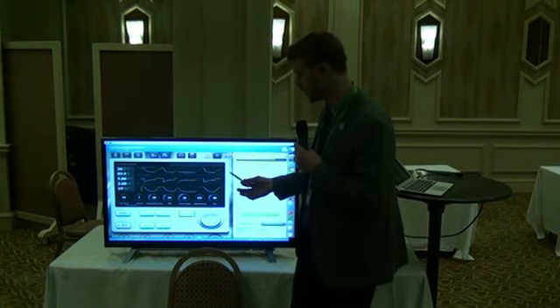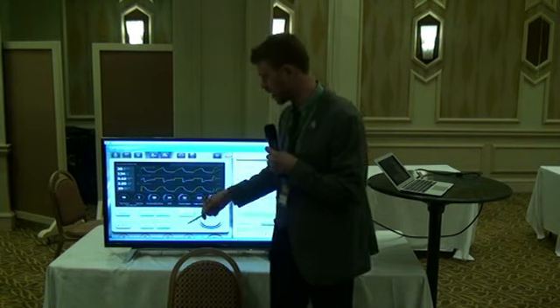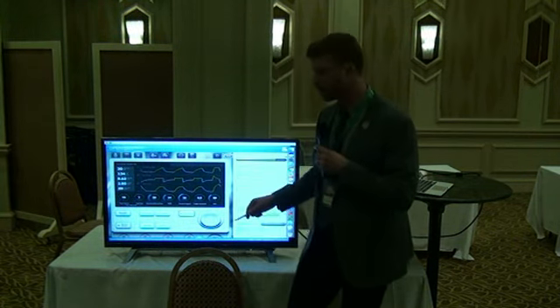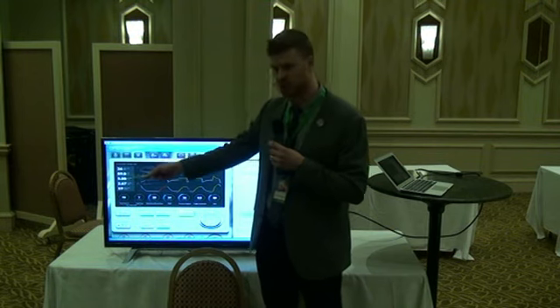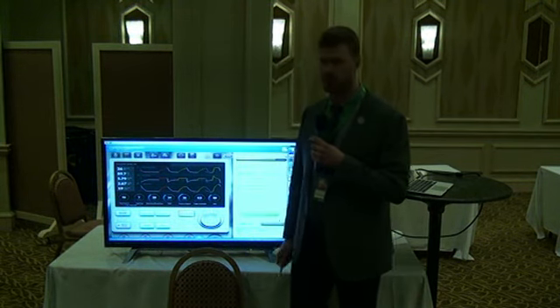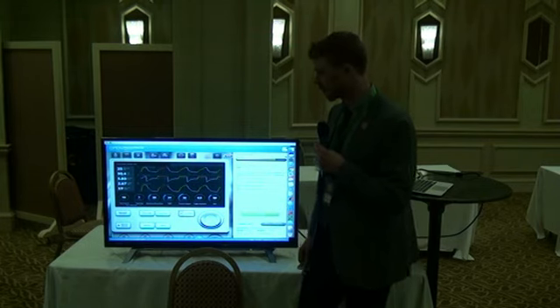But as you're turning all the knobs on the ventilator, I'd probably suggest coming down on the volume as much as you can and just increasing the respiratory rate so that you can decrease the peak inspiratory pressure. You can see here it's pretty high. It's like 26 or 30, right? So that's a pretty high inspiratory pressure that puts our patient at risk for a pneumothorax. But I think that's about it.